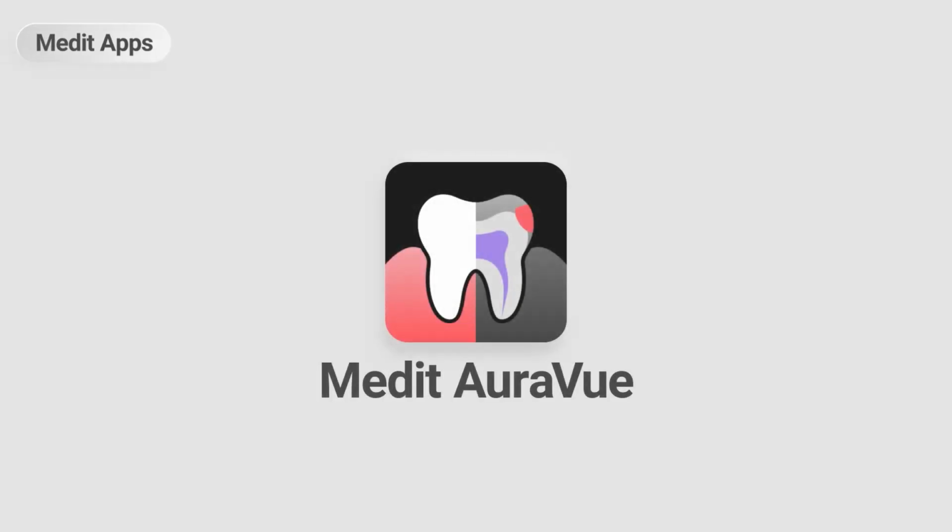With Medit AuraVue, turn complex explanations into clear visual reports.